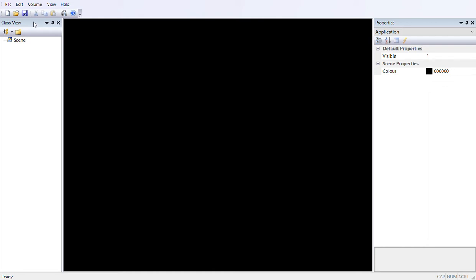Hi, today I'm going to demonstrate current progress on VolumeDesk, which is a volume rendering program. This is the kind of program you use to turn three-dimensional data into rendered surfaces for display. It's the sort of thing you might use for geological data to turn strata into viewable surfaces, or in medical imaging. Perhaps the input to this would be data from an MRI scanner or CT scanner.